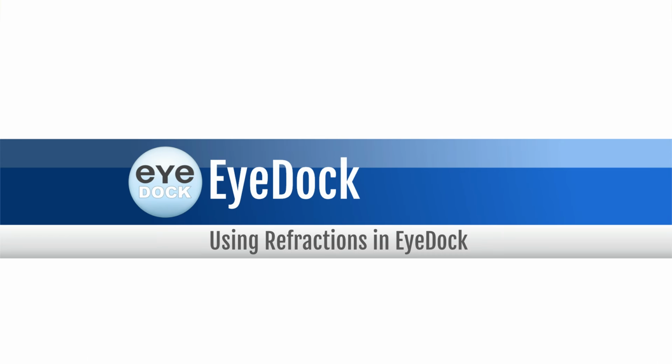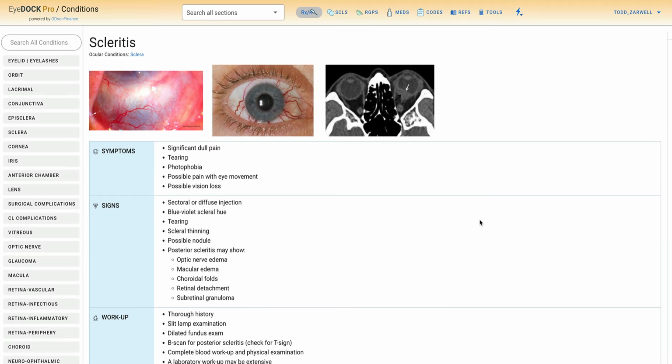I'm the developer of EyeDock.com, and I wanted to show you what is, I think, my favorite feature of EyeDock, at least the one that I use most frequently in the clinic, and that is searching by refraction. So for pro users, you can always just type in refraction in the search box, and that will help you find contact lenses. But I've really tried to make it easy to get refractions into EyeDock because they're so critical to so many things we do.